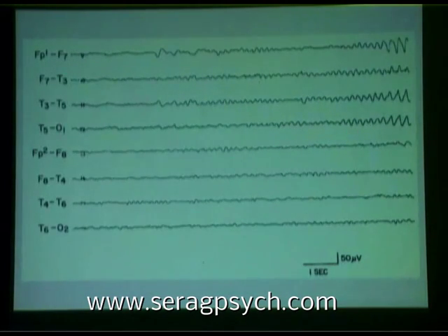Next, please. Now, this is a seizure. We described this, Brian Young and the late John Lemieux and I studied the morphology of electrographic seizures in 1984. We published this 22 years ago now. And we found that one thing that characterized electrographic seizures from normal phenomena was an evolution in their morphology.